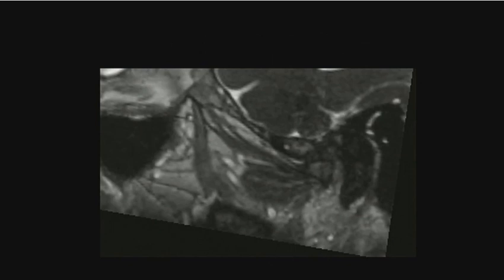The last case here, this is a patient, again, in sagittal section through the parotid gland, and here we have the facial nerve exiting the stylomastoid foramen. And as it continues towards the parotid gland on this post-contrast imaging, suddenly we don't see it any longer. And why don't we see it any longer? In a manner analogous to that case I showed you of the interdural sixth nerve, we don't see it any longer because the nerve is pathologically enhancing. And this is a case of perineural spread of a basal cell carcinoma in the facial nerve within the parotid in the extraforaminal segment.